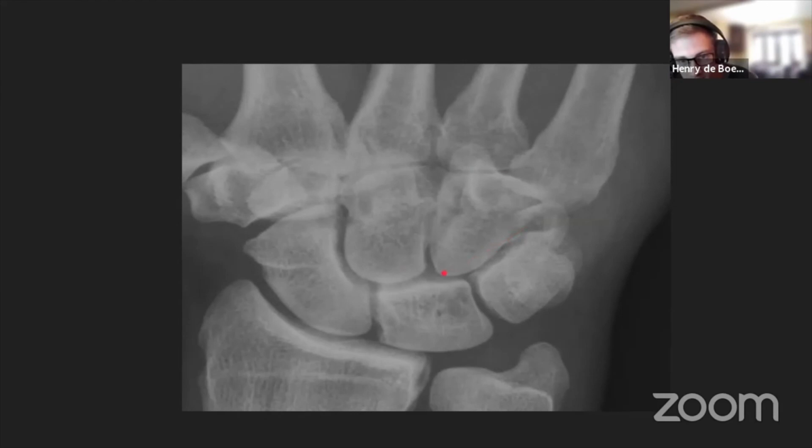But what we're seeing here, if we're tracing the capitate here, sorry, hamate, yeah, hamate, there is a fracture. This bone fragment here, where's that come from? Yeah, exactly. This cortex here, lucency, something's not right. There's a hamate fracture.